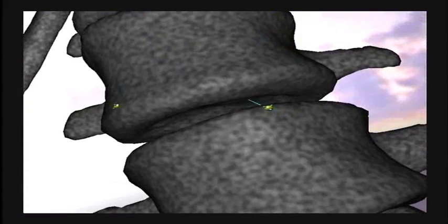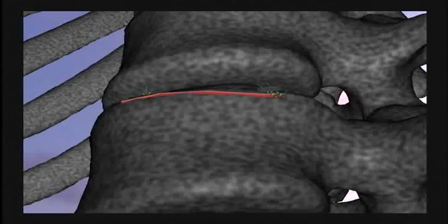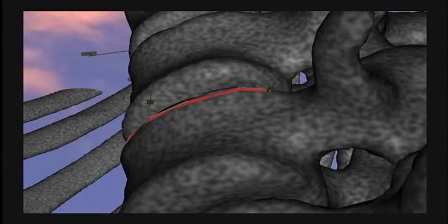There's a multi-point option that lets you measure the distance along curved surfaces, keeping a running tally of the length. Two-handed operations will lend themselves well to area, volume, and counting operations as well.